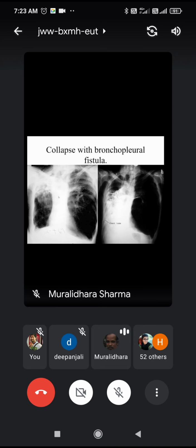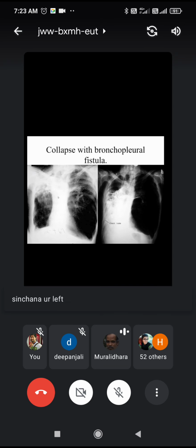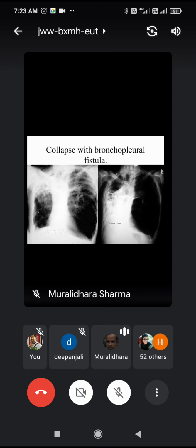That results in the collapse of the lung tissue, but it may not be a total collapse, and there again there can be atelectasis. Now, this is one of such evidences. The patient had a pleural effusion, along with some lesions over the superior segment, which could be like a dense mass, and there is a partial atelectasis seen in the right middle lobe area.